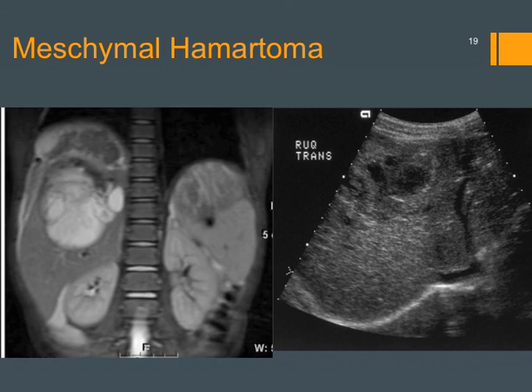Mesenchymal hamartomas are usually more heterogeneous than hemangiomas. Notice the cystic spaces in this patient.